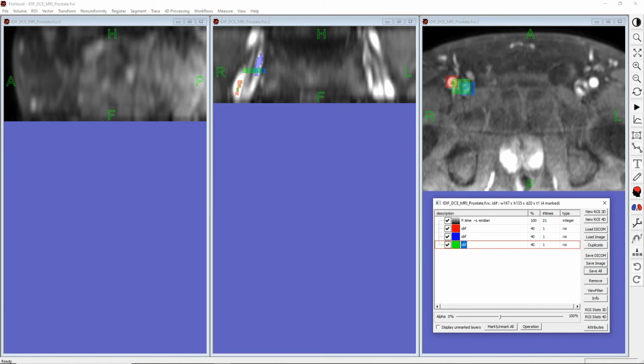If an input function is derived from a location where arteries and veins are in close proximity, mixing of their signals may be minimized by careful drawing of the vector regions of interest and by adjusting the curve similarity parameters such as the time and magnitude tolerances.